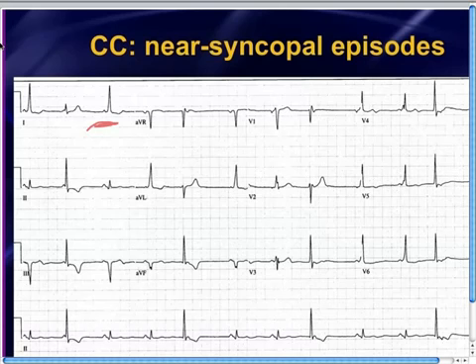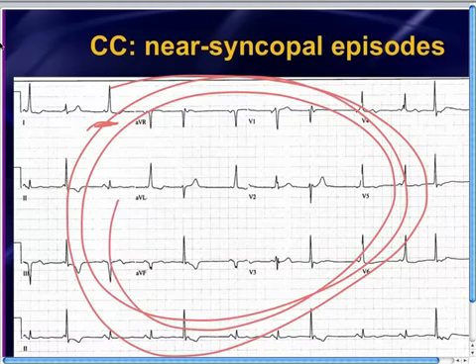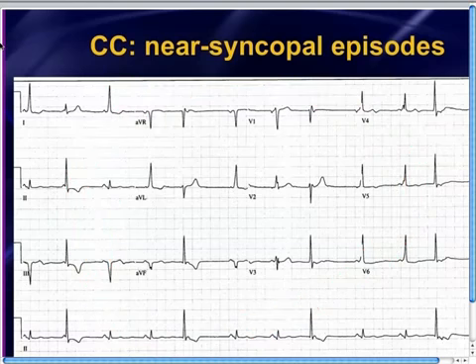So if you're looking for possible WPW and you've been tipped off to that because there's a short PR, look in all of the leads. Okay, look in all 12 leads for delta waves. And in this particular 12 lead EKG, when you look in all the leads, it turns out that over there in V5 and V6, those are really prominent delta waves. If we blow those up, you see a nice P wave, and then it goes right up into that QRS complex. Very, very nice delta wave. You can't draw it any better than that.